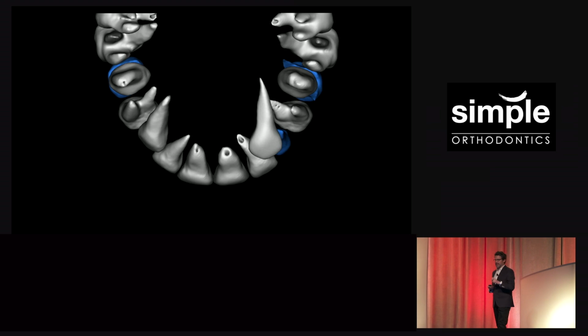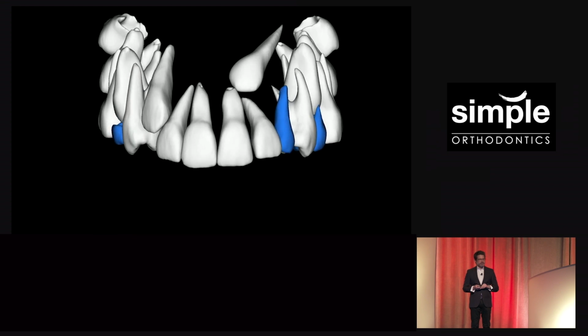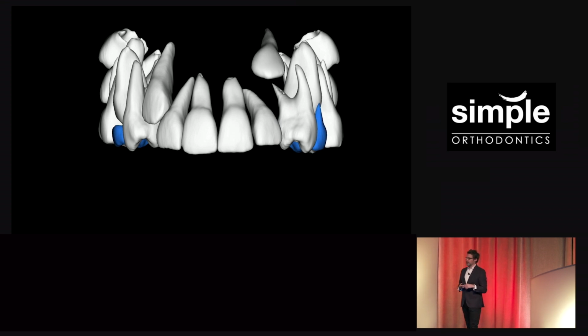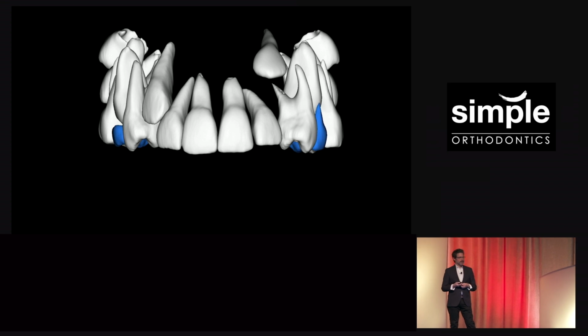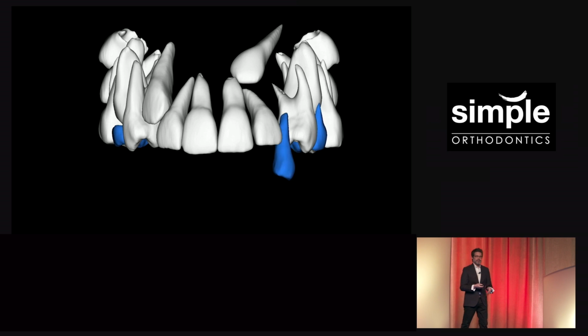This is my simulated mechanics. Anything that's in the way of that crown, bone-wise, get it out of the way. So anything above the CEJ that's bone, get it out of the way. Because this is how I'm moving it, because I don't want to touch the lateral incisor or anything else. And the surgeons now know they've got the instructions. They can look at it and say, I know just what to dig.